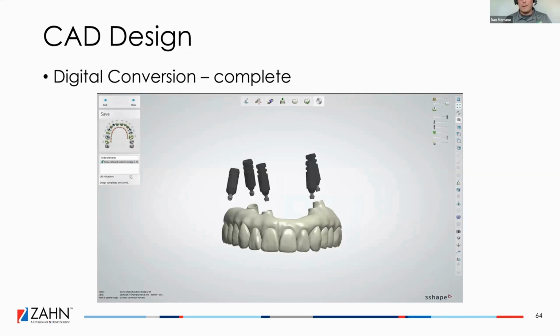And then you're complete. I mean, these things are pretty quick. If you have a good pre-design and you have a good plan, these things work well. I like to pre-design as well because I like to spend a little extra time making sure that I've dialed in my design. I'm checking those photos. I'm making sure everything cants the midline, everything is correct. So I do like to pre-design.